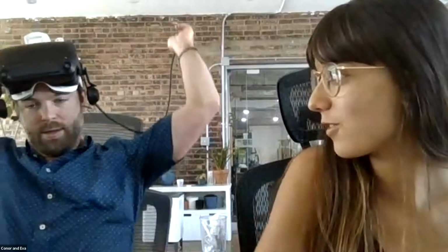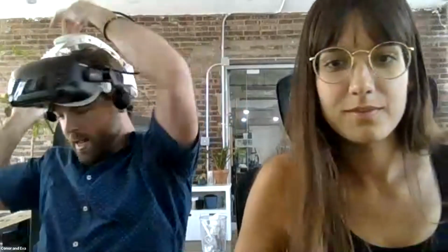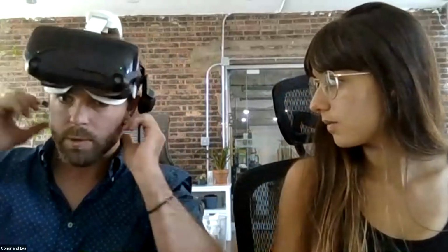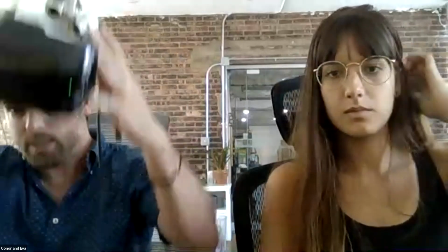How do you feel in terms of comfort? I feel pretty good. By the end, I was definitely feeling the headset, but I had not reached unbearable levels of discomfort or pain. So that's quite encouraging. Ear clips coming off.